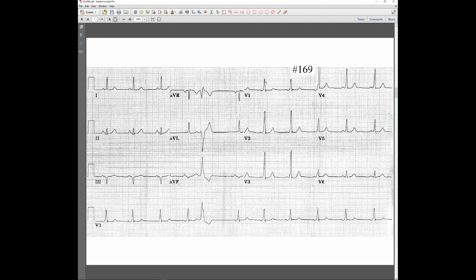Is it clear for everybody? Sorry, why is it left deviation when aVF is...? Because lead number 1 was positive. You are on the left side. In aVF, which is the only one where we have a normal QRS complex, it is mostly negative or equiphasic. You can say it's 0, or a little bit less than 0, maybe minus 10. And this is why he said that's a left deviation. But not extreme left deviation because lead number 2 is positive. Okay.